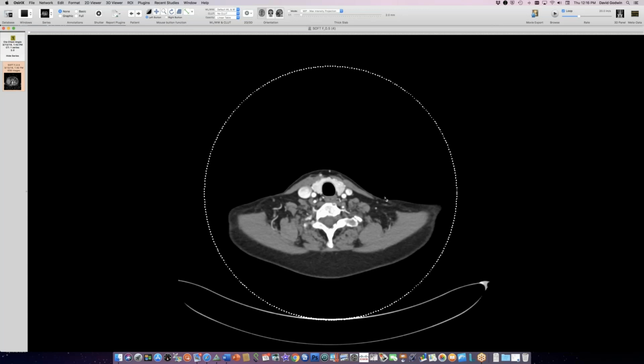Right. But I've also seen in people with recurrent infections who get bronchiectasis who then get sort of an upstream phenomenon. Okay. Yeah, I like the fact that the trachea is more lemon-shaped, not spherical enlargement, as David said, because that's usually what you see with COPD or patients with fibrosis. Mm-hmm.